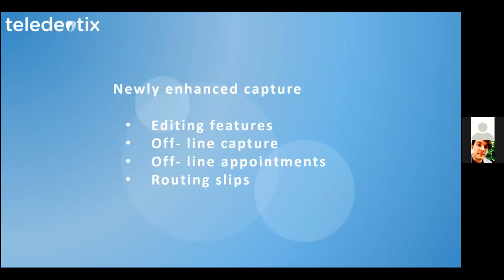So now with the newly enhanced feature, you are able to add an appointment into the system, and that new patient will have a routing slip that you can enter all of your notes and provided services, obviously capture images, and enter progress notes. So that's a really exciting feature we'll be going through in just a second here.